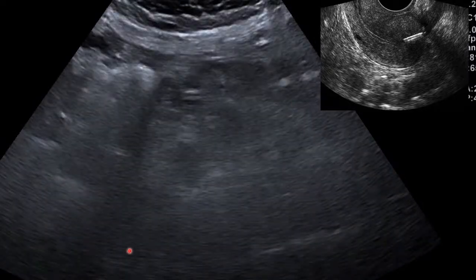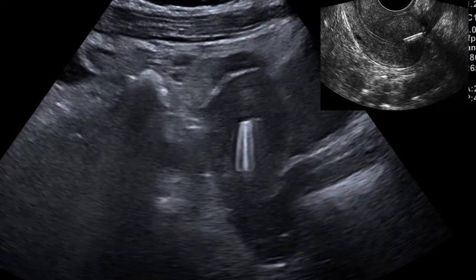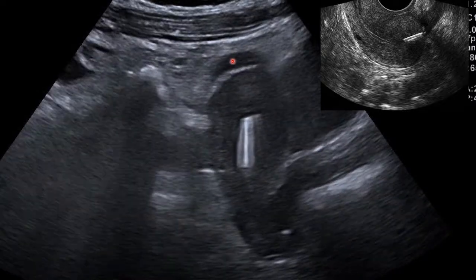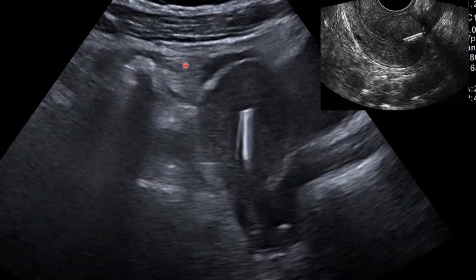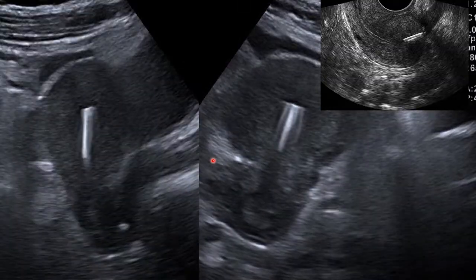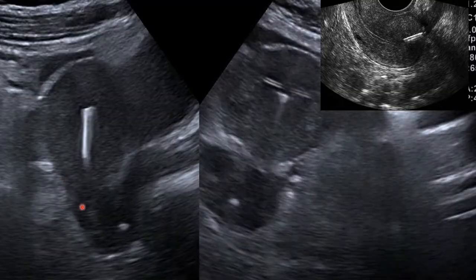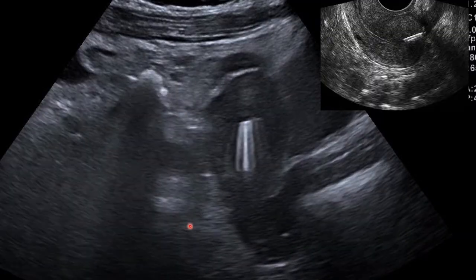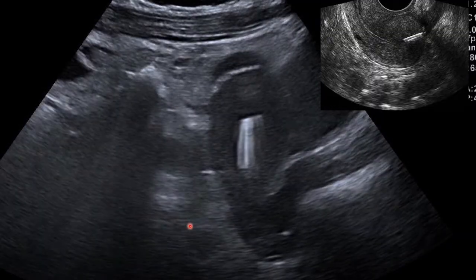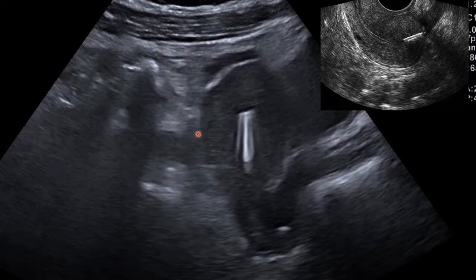So you also have to assess the adnexa for possible masses that you can see in the adnexal regions, and no sonographic sign of tubo-ovarian abscess. If there's any hydrosalpinx or ectopic pregnancy, you also have to make sure to look for those. So you must also appreciate the back of the uterus, the pouch of Douglas, to see there's no free fluid in the POD or any complex collections. So those are the things that you should look into.